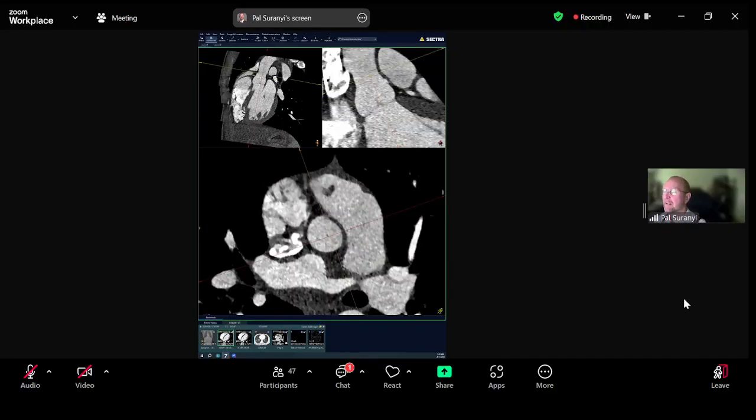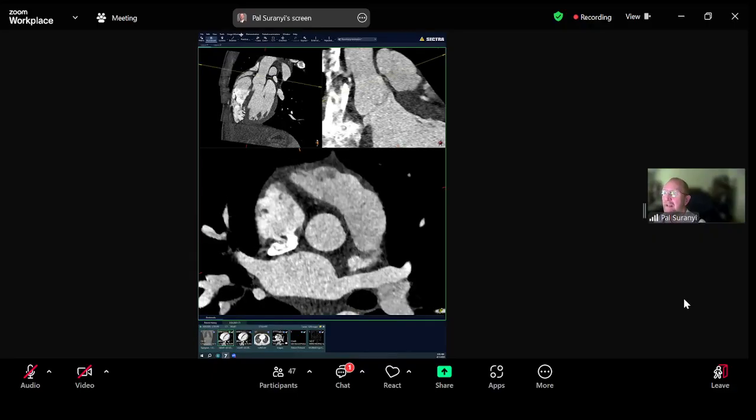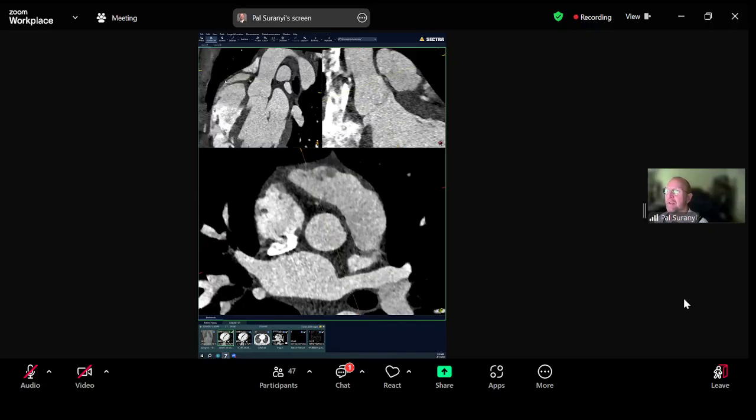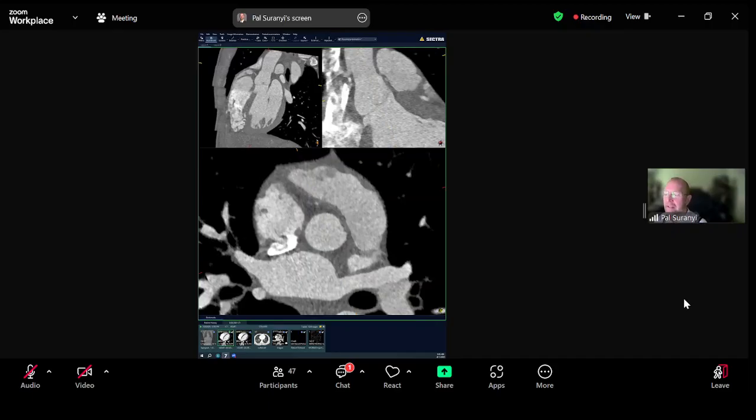The last thing I'm going to say here is, due to the low radiation dose that we used, the images are a little grainy, but we used EKG synchronization, of course. You also see a misregistration right here. That was probably patient motion, probably respiratory motion. If you look at the chest wall, you can see that it was moving, so it's clearly not arrhythmia. Probably the patient was startled by the contrast injection or was scared and couldn't follow instructions properly.